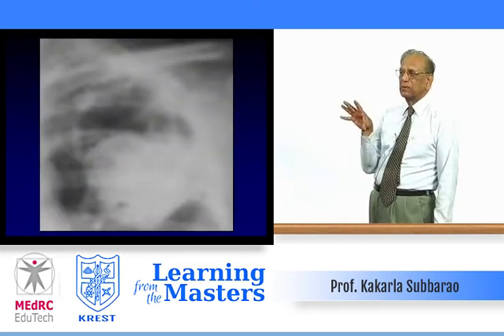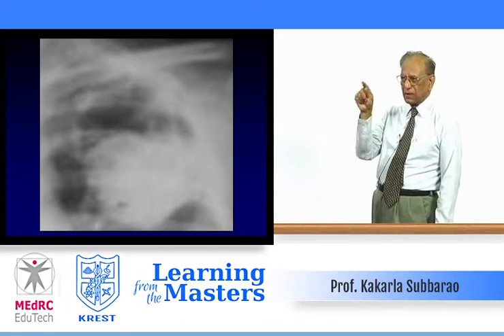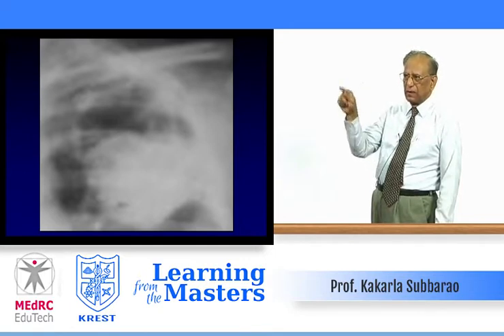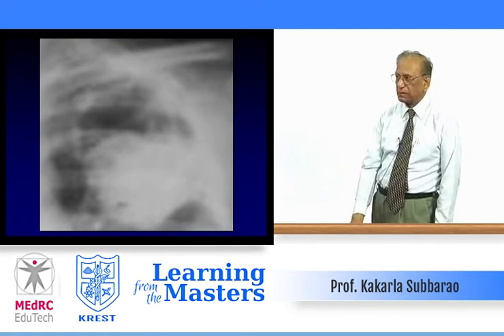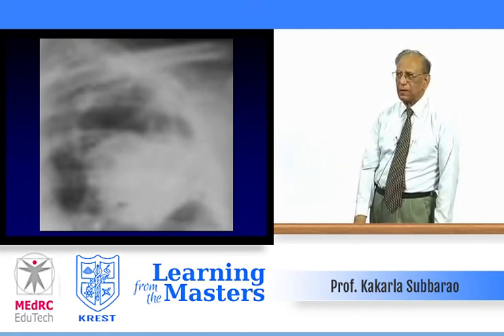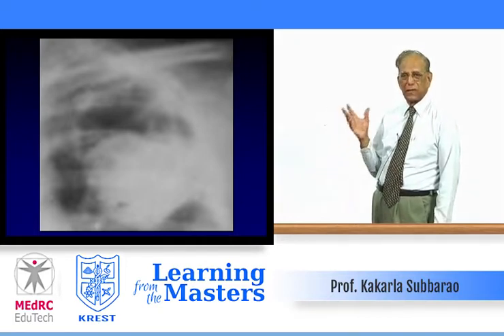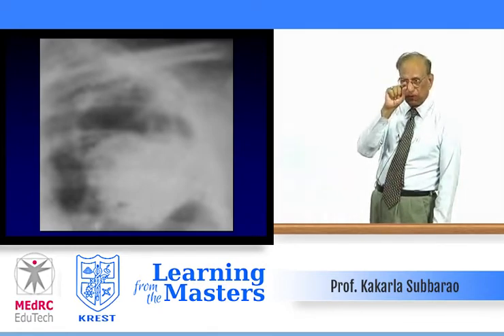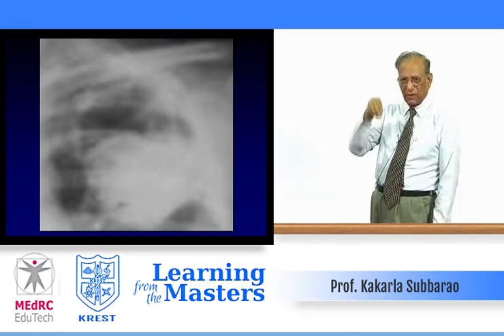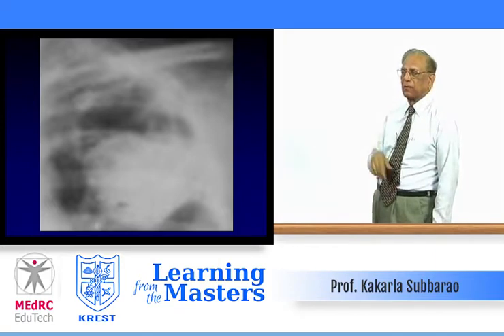Close-up view, again a meniscus sign, and the lower portion is solid, the so-called tit sign. There is an opacity in the dependent portion. That is an indication of a hydatid cyst. Somebody from India has described a tit sign, that is, you see an oval opacity, sometimes rounded, but if you look inferiorly, as though by gravity, it assumes an oval opacity, oval contour.